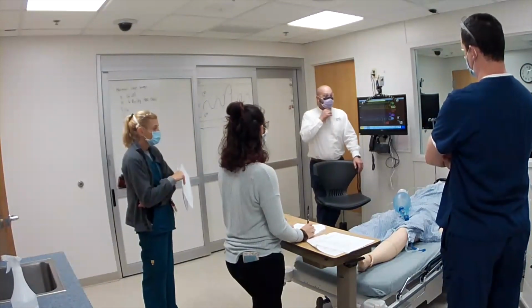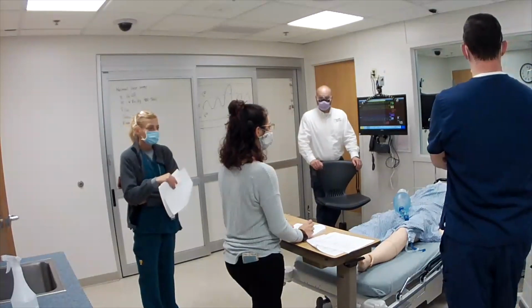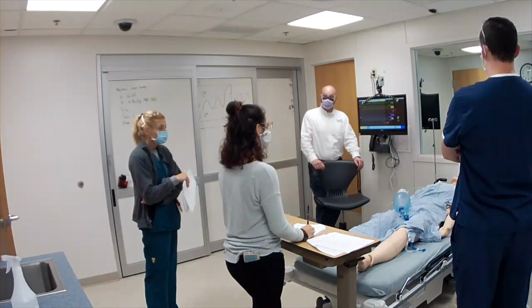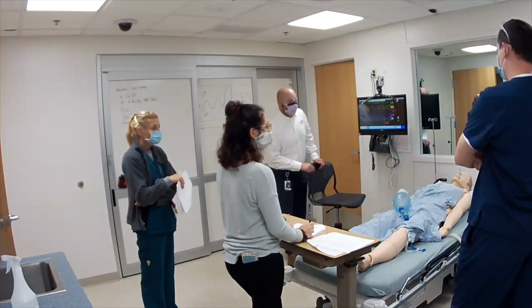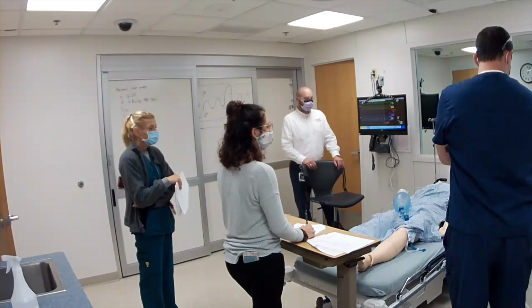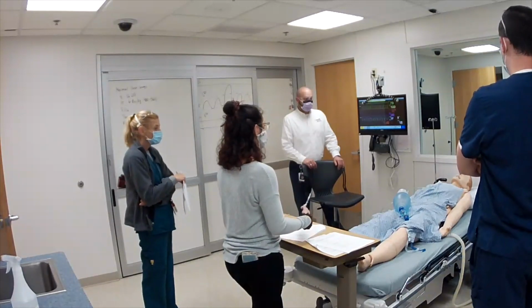Work of breathing. What's Stanley doing? Nothing, is he riding the vent? Yeah, he's riding a vent. He's doing nothing. Our work of breathing number is like 1 or something, right? And that's joules per liter, I think, or something like that. So it's talking about his work. And Stanley's a bum. He's not doing any work. Okay. All right. So let's go back to the main page.